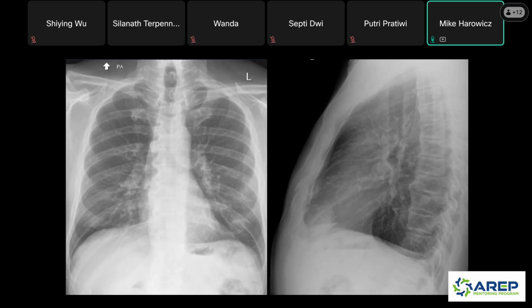And this was actually a case that I read. I called the clinician up because I was like, oh, hey, maybe if they have a cough or something, I think this could be pneumonia. Like, what's going on with this patient? And they actually said they weren't worried about pneumonia at all. He said the sharp rib pain was pretty acute onset last couple days. And again, no trauma, no sick contacts, no anything like that.